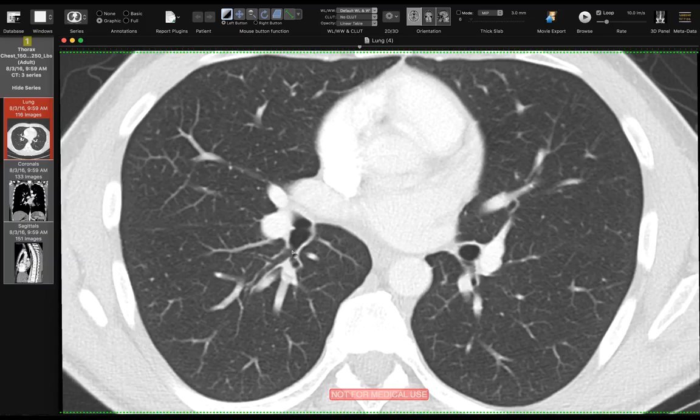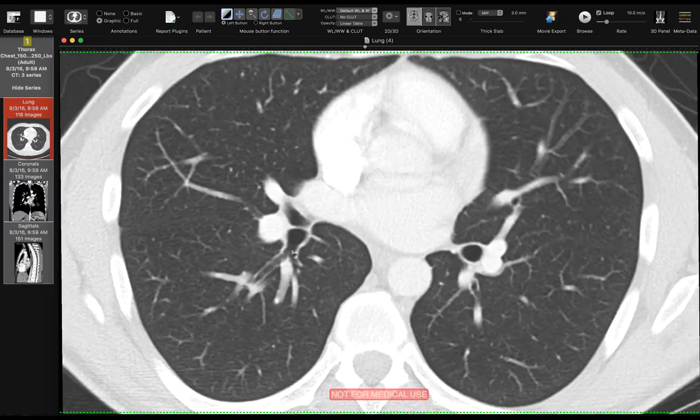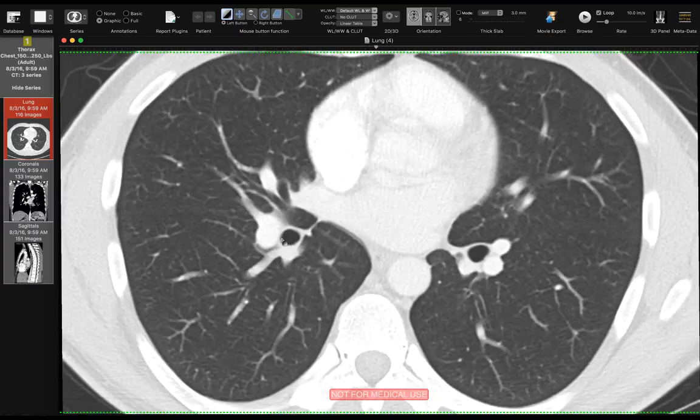Okay, so after the superior segment comes off, we have this bronchus here, and this is called the truncus basalis. The truncus basalis is the branch of the right lower lobe after the superior segment that gives rise to all four of the basilar segments. And the order in which the basilar segments branch can be remembered with the mnemonic MALP, M as in Mary, A, L, P.